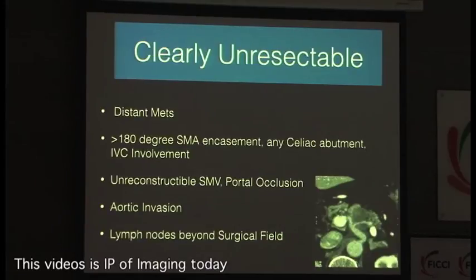And now comes the problem, and that's a clearly unresectable tumor according to the NCCN criteria. That's the celiac trunk, everything is surrounded.